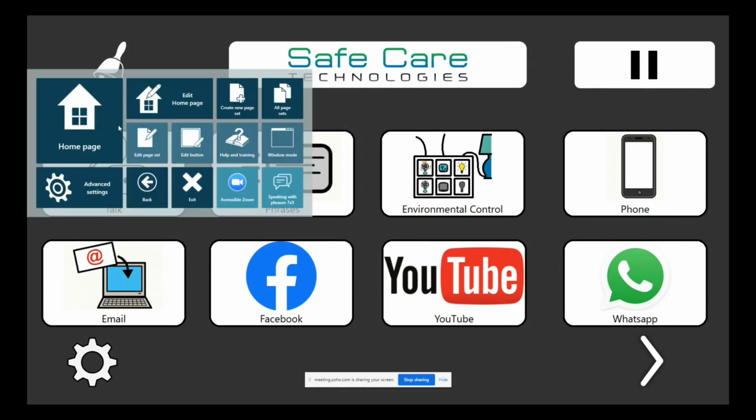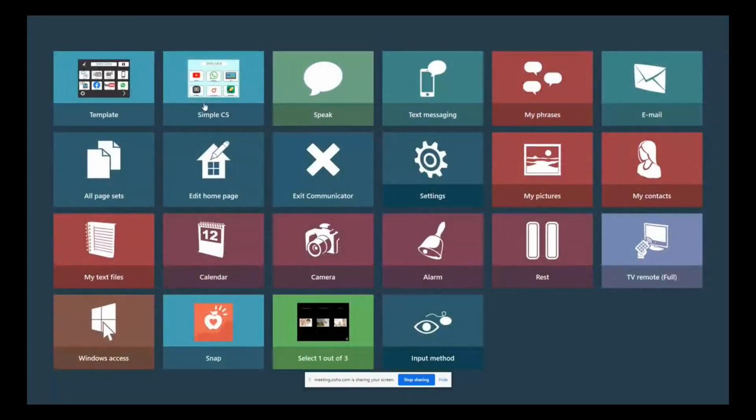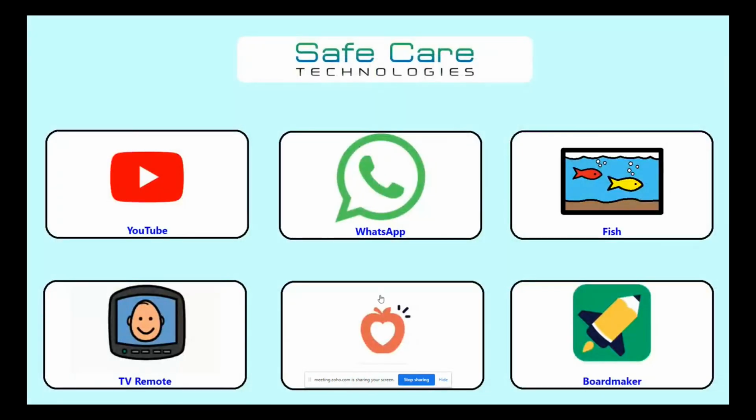So for maybe somebody who doesn't require that level, as I said, we use Snap a lot for our symbol communicators. The great thing about maybe Tobii devices is that if you get an i110 or an iSeries, you get Communicator and Snap Core included. So you might decide that you want Snap Core for your communication for symbol, but you want to get those features from Communicator for those YouTube and WhatsApp and accessing your TV. It's very easy to do.